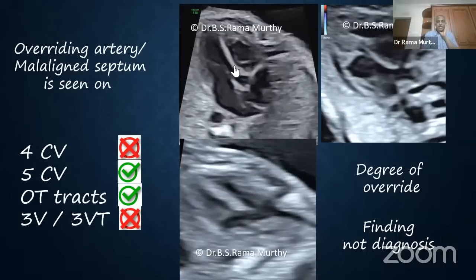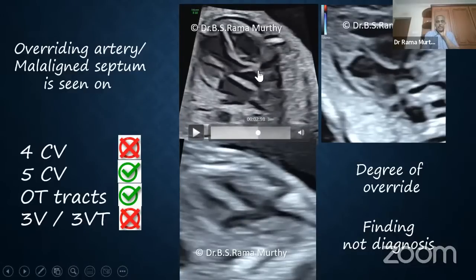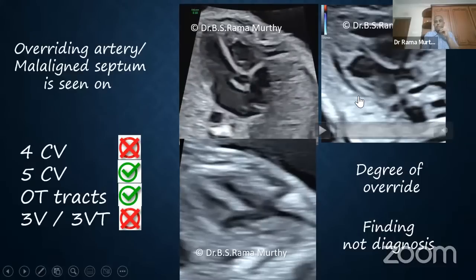All of us are very familiar with this. Let me take the bookmark here and you will see that there is an aortoseptal continuity, which we all know is one of the major points in the checklist that we do when we study the LVOT. So that's absolutely normal. Now let's move to this clip.